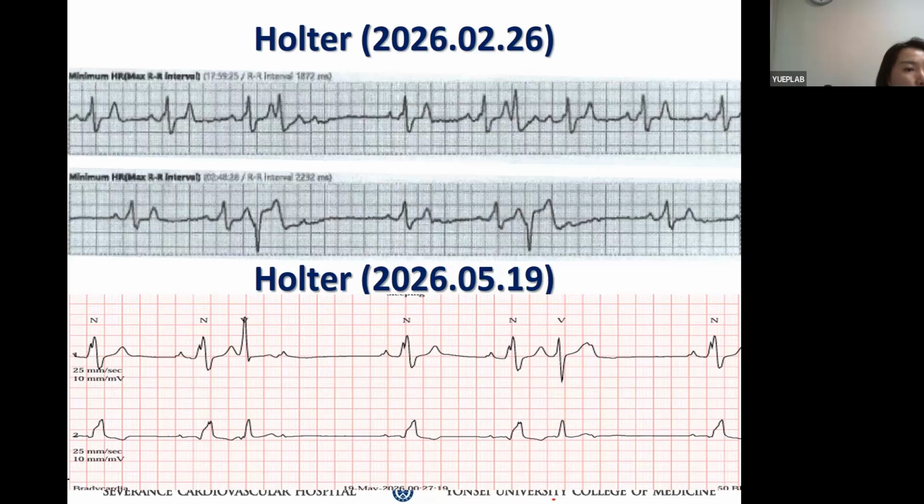This strip probably answered our earlier question whether that third P is different or not. If you measure the PP interval now, even though there is RR interval modulation, and your PP interval is the same, then that's a sinus P, not conducted. On the other hand, if your R to P relationship changes, then this is modulation by the PVC. That is the answer. Because if the sinus node is a parasystolic phenomenon, the sinus is going to fire no matter what. On the other hand, if the sinus node is under the influence of modulation, it's going to be shorter. So measure the PP interval again, and then we will know the answer.